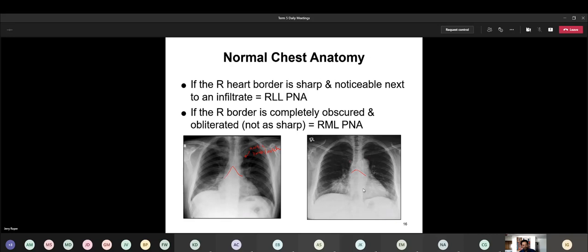This looks to be overexposed. In addition to me, it picked up the pneumonia without a problem, but just looking at how really dark the lung fields look, this isn't like two pneumothoraces that we're experiencing here. This is the case where the person who did this film probably didn't have the settings completely accurate, and the film ended up becoming overexposed. So it looks almost like burned. I guess you can think of it that way. And underexposed, you know, everything would just look too white.